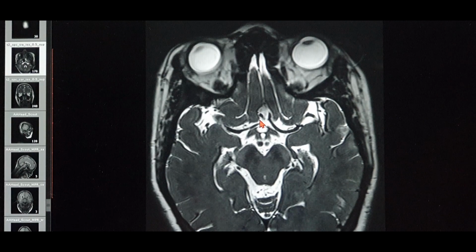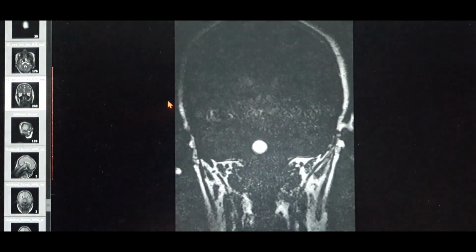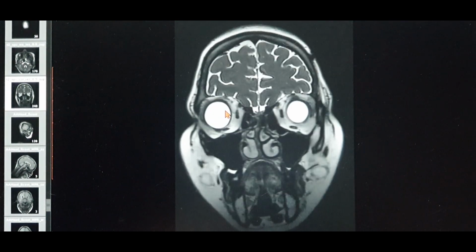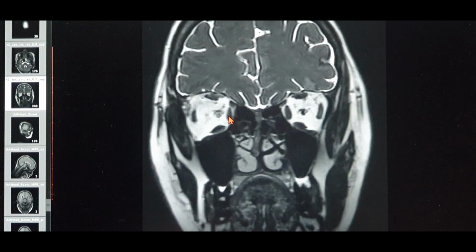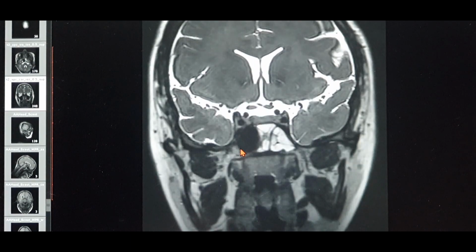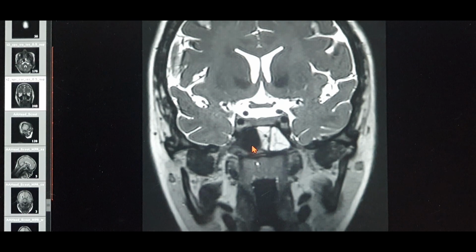Also, I showed you the vertebral artery, the circle of Willis, the MCA, the ACA, how it looks on an axial scan. The same thing you can follow on the coronal scan. You just have to look for the flow voids. I'll just give you a quick look at the internal carotid artery on the coronal section. As you can see over here, normally an ENT surgeon or a skull base surgeon or a neurosurgeon will look at the area of the skull base, and they directly look for the carotid arteries over here.